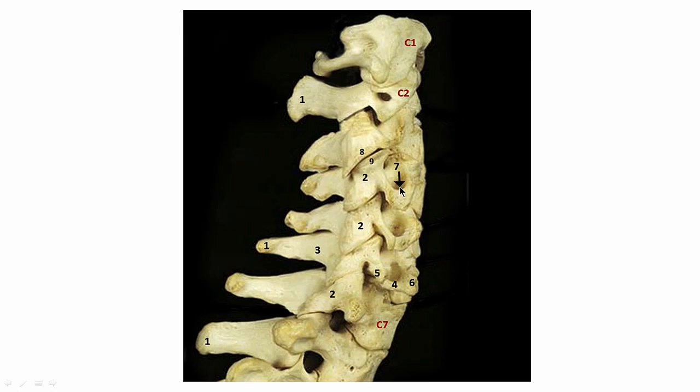This is the transverse foramen. Foramen transversarum is another word for it. It goes through the transverse process, which you can kind of see here. You can see another transverse process here, and another transverse process here. So we've got some parts of the transverse process. It's quite complicated actually in the cervical spine. So you have an anterior and a posterior root that make up most of the transverse process.